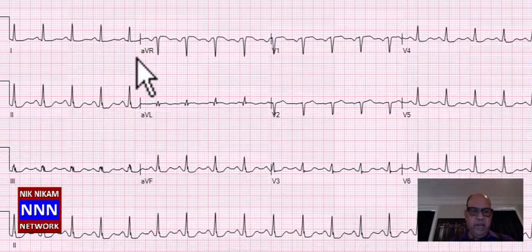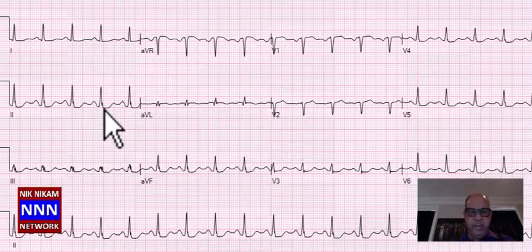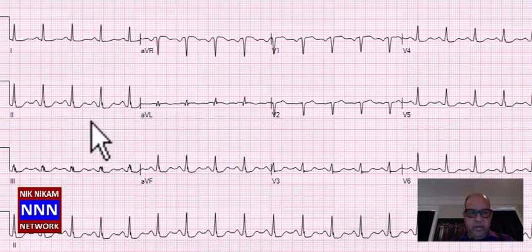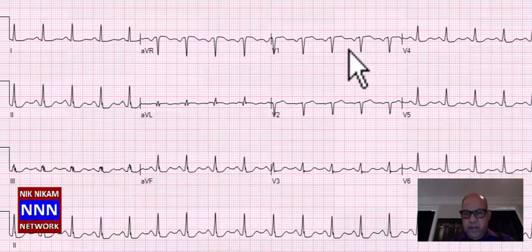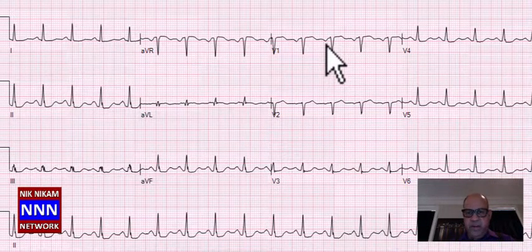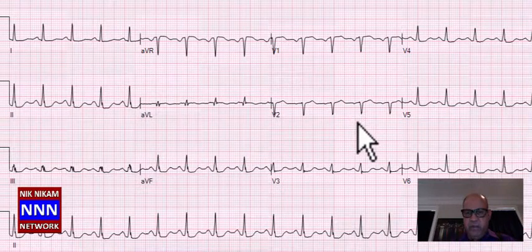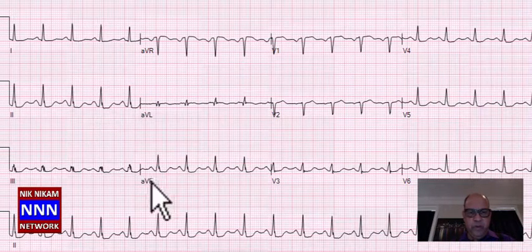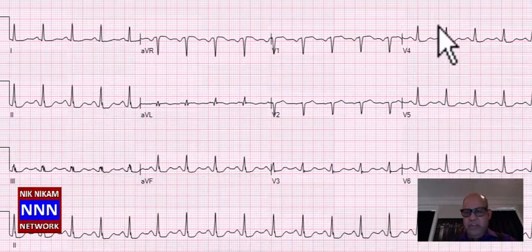We have a sinus rhythm here, some non-specific ST changes. There may be some ST depression in the lateral leads and also in the inferior leads. So this is an abnormal electrocardiogram. Along with that, I think there is some evidence for left atrial enlargement, loss of R wave progression in the anterior leads. So we have a sinus rhythm with left atrial enlargement, possible old anteroseptal myocardial infarction, along with some subendocardial ischemia, which is sort of diffuse, involving the inferolateral chest leads.